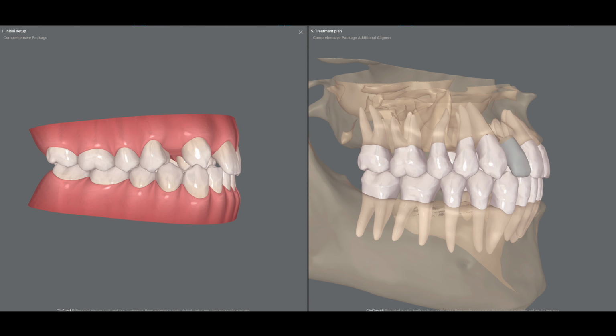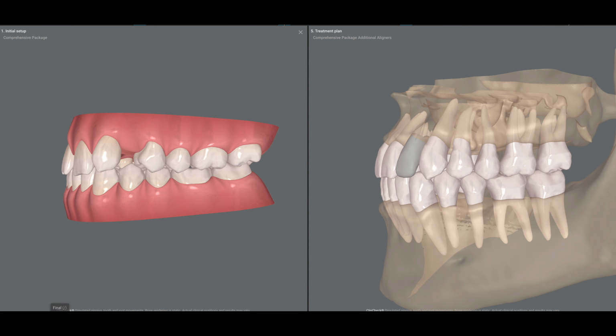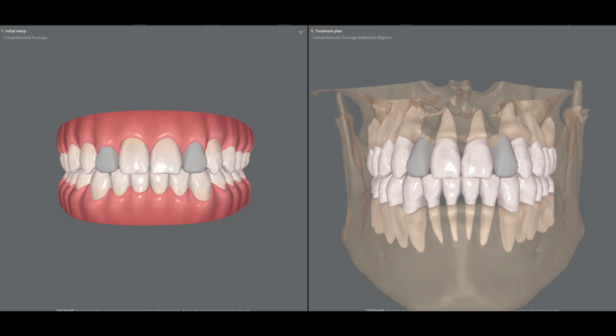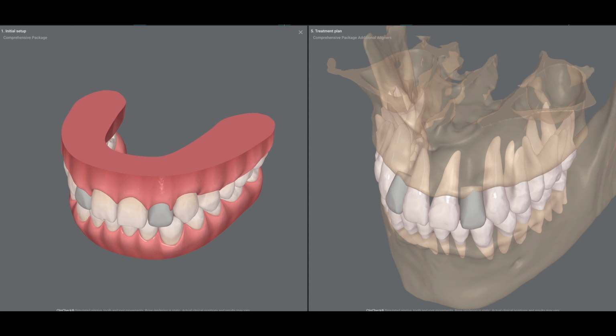So again, opening lateral spaces. The upper left canine really had to move back into a good class 1 bite. And then current, getting those roots opened up enough for a good clearance around the implant when it is eventually placed.